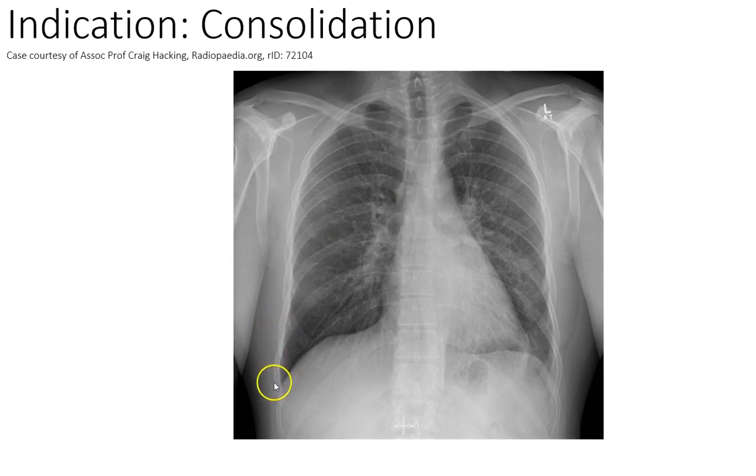So now I'm looking at this angle and it's nice and crisp, a beautifully crisp hemidiaphragm there. On this side, not so much. It's looking a little bit less crisp than that side. Not too bad in this lower lobe. The heart, you've got a bulge on this side, the majority of it on that side. The size of it is probably about a half, and that's okay. This is less distinct, and this is not too bad through here, but there's certainly something going on maybe through there.